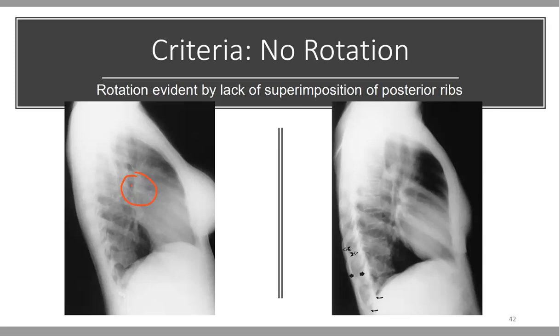Now that dark circle is like looking down the barrel of a hose, let's say. So we have our water hose, and when we look at it from the side, the length of it, imagine that as the trachea, and the trachea is bifurcating into the lungs. Now let's say you took that hose and you're looking down the barrel where the water comes out. That's exactly what we're seeing in a lateral chest x-ray. It's as if we turn that trachea, that water hose, to the side.